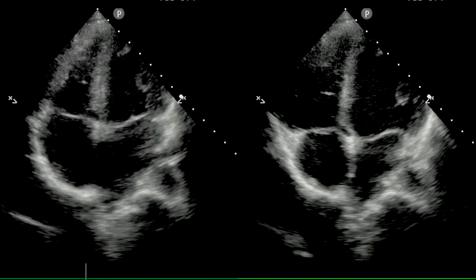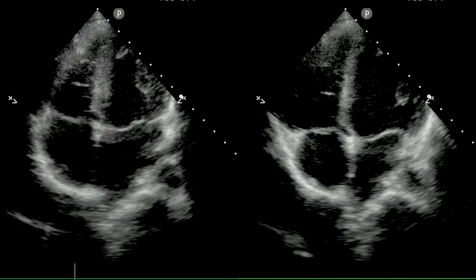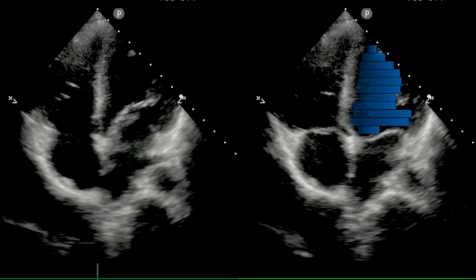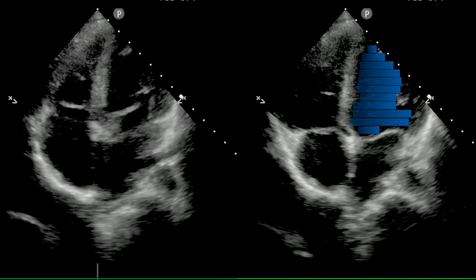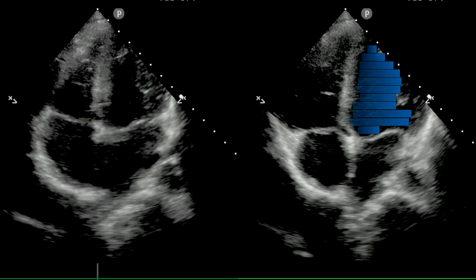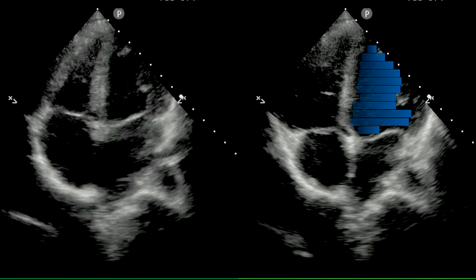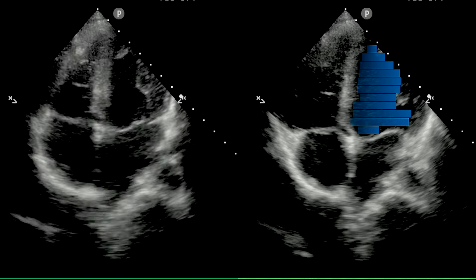And we see this. Let me back up. We measure this volume as the distance from the endocardial wall, right? And so as we think through the Simpsons method, we stack these discs up. They kind of stop at the inside of the chamber, along the endocardial wall. And so as we piece this together, we have to remember, okay, we see the thickening, we see the movement. What do we see in the thickening and the movement do? And what do we really care about in this context? And that is the volume change, right? And so we want to know how much blood is inside that chamber, right? Between endocardial wall to endocardial wall. And as it moves, as it thickens, it's going to decrease that chamber size, right? And that's what we're going to see kind of in this stacked discs.